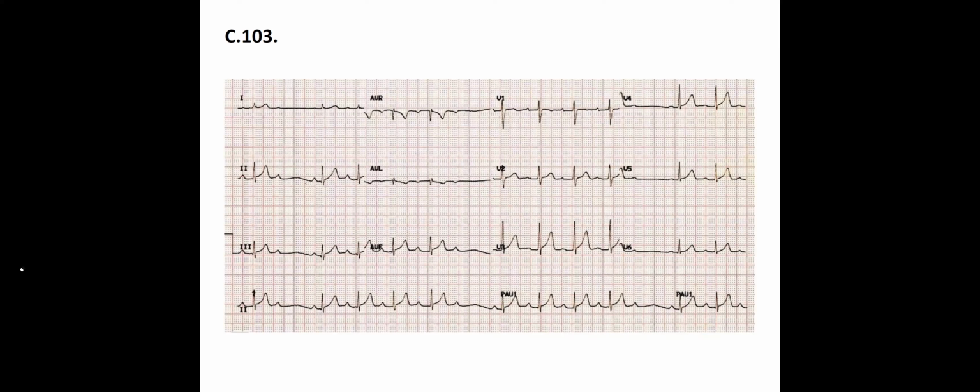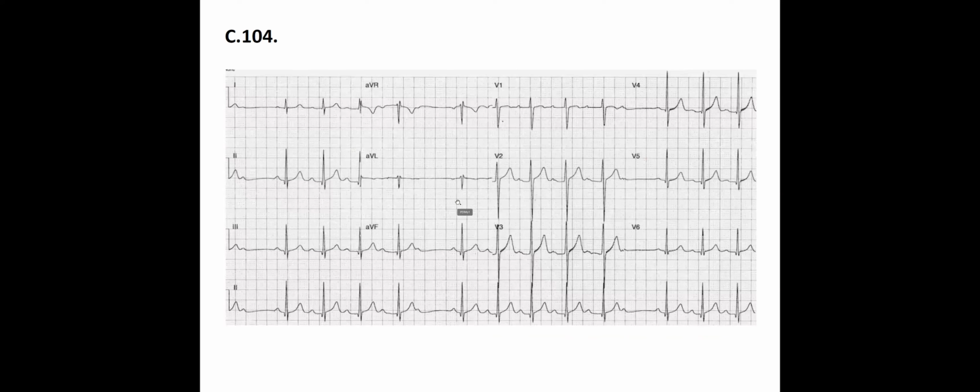Wait a minute, I have to close this annotation. Okay, 104. Anybody has? Yes.